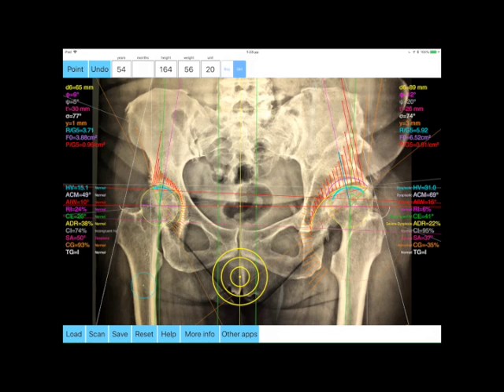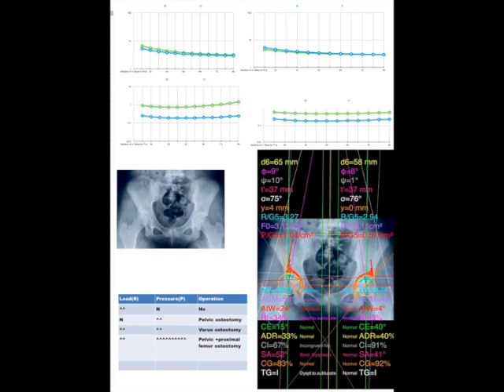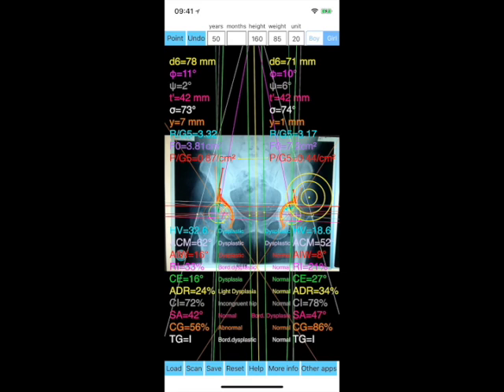Besides that, the app provides data for export for diagrams of load, R, and pressure, P, which each can be plotted as a curve, allowing easy comparison with normal data and thus helping the orthopedic surgeon decide which procedure is objectively indicated. Data are exported as a TXT file, ready to print or to input as cells to Numbers or Excel, ready for chart printing and further research.